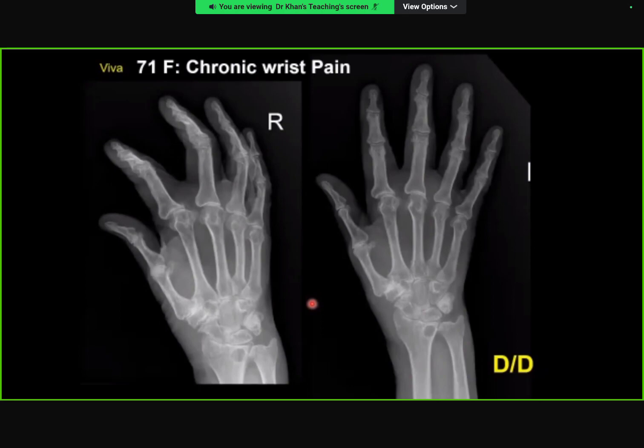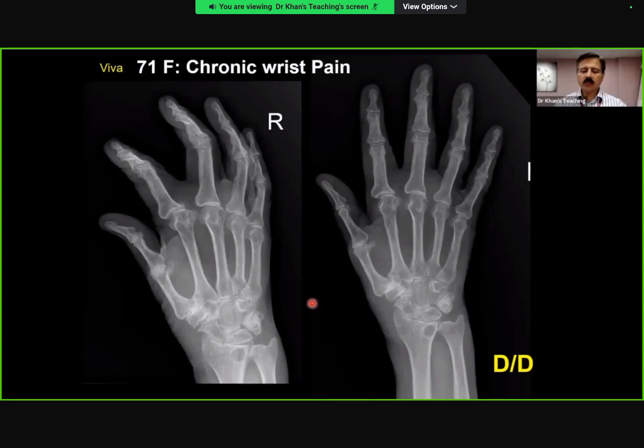So my differentials for this epiphyseal location and a benign lesion would include, again, GCT, but looking at the history of chronic wrist pain, I'm also thinking whether this could be an underlying geode, which can happen in degenerative disease. Other than the parameters you have described, radiologically speaking, is there anything in this case which is slightly atypical for a giant cell tumor?